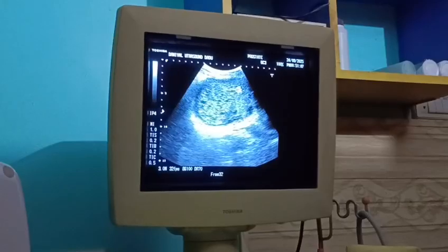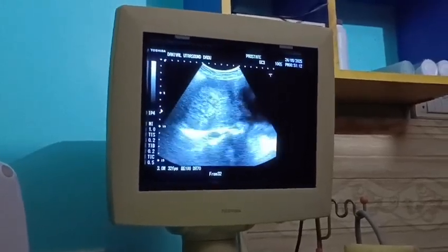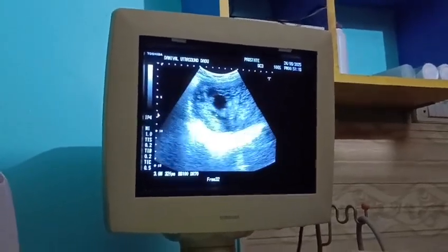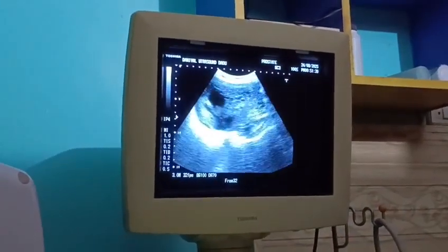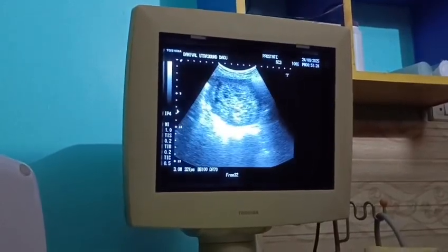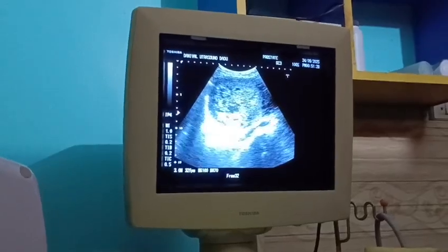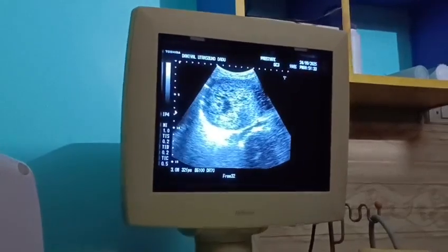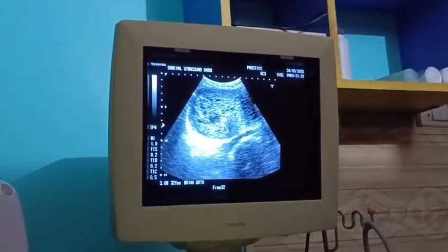And one more important thing is that it mimics missed abortion, but it isn't. These are changes which have taken place due to the trophoblastic disease. And another differential diagnosis could be degenerating fibroid, choriocarcinoma if highly vascular and invasive, or hemorrhagic products in the uterine cavity.